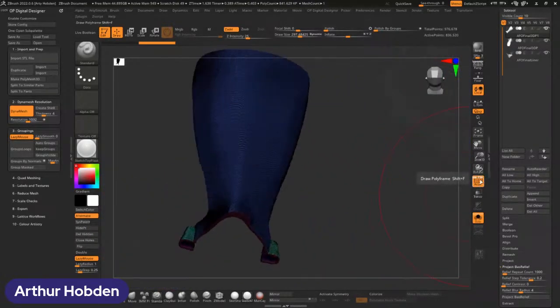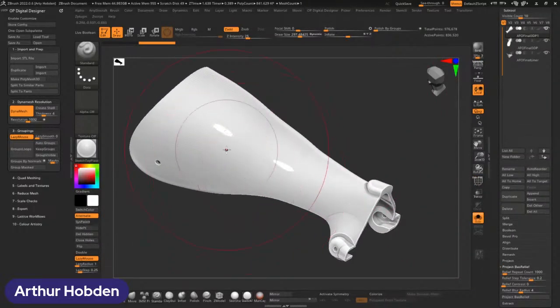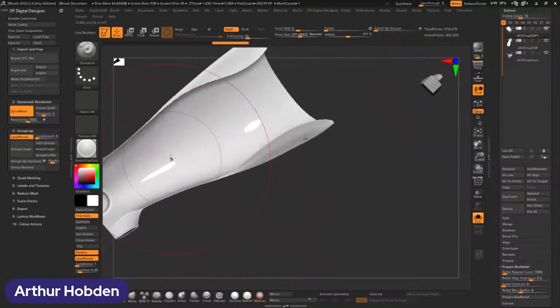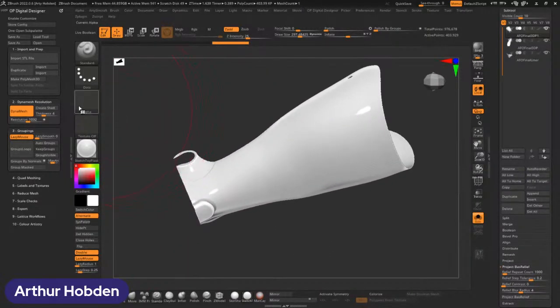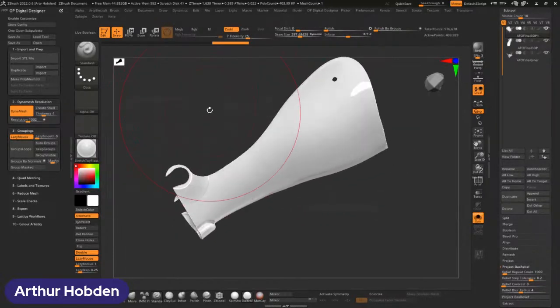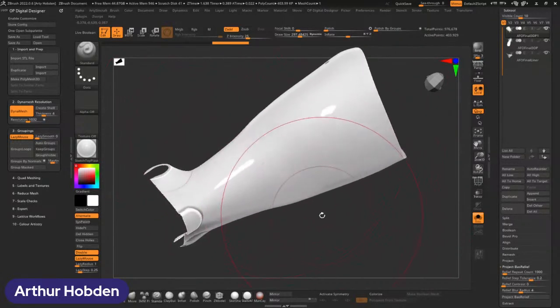So let's try and add a texture to the back of this. How would we do that? Well, I can Control-Shift, select the part I want to work on first off, and we can hide everything else except that grouped surface, which is great. And we can now look at making a group inside this group for the window of our texture.